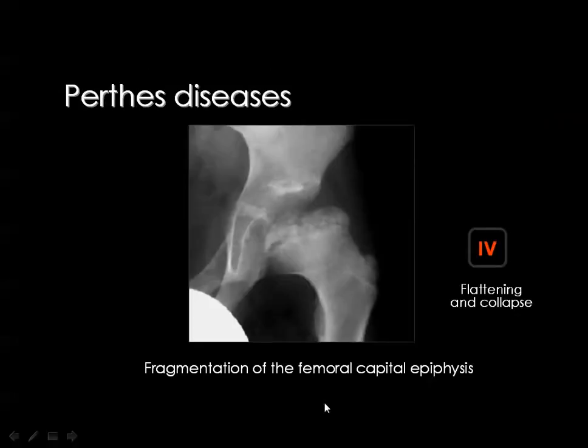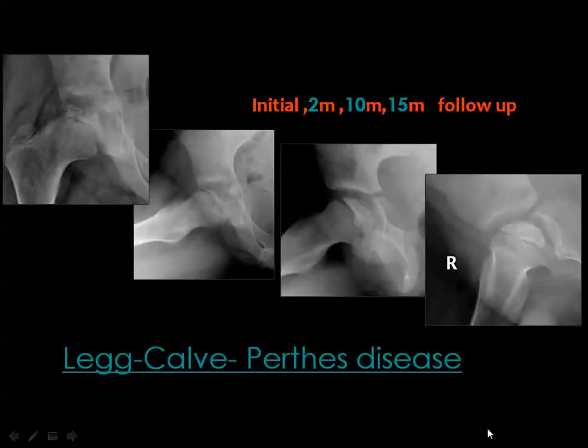And this is stage 4 Perthes disease of the left hip. You see flattening, collapse, fissures, sclerosis of the capital femoral epiphysis together with this metaphyseal reaction. Perthes disease can also be treated conservatively, considering the non-weight bearing maneuvers as well as the supportive measures, and you may get complete healing on follow-up studies.